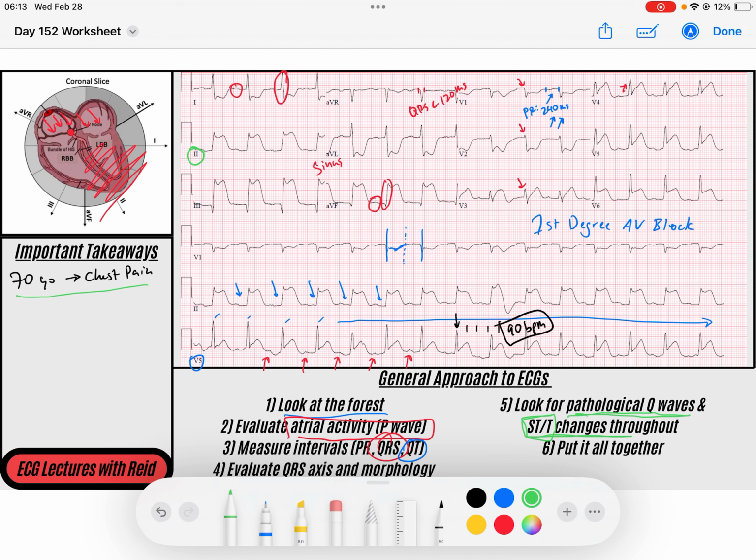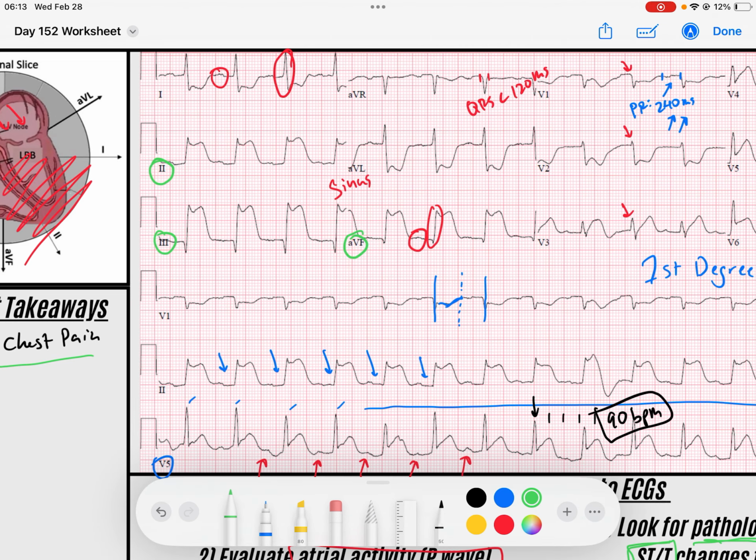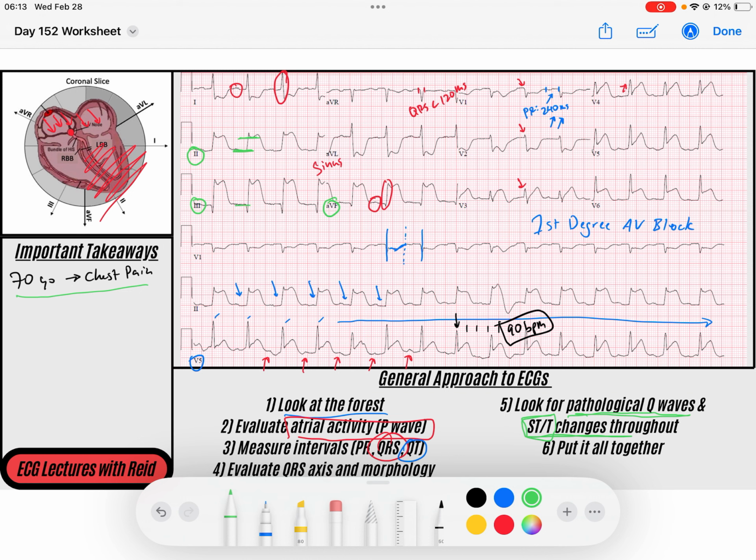So the first thing I think we all noticed is we looked at these inferior leads, and maybe we skipped a beat after seeing those, right? And you look closely, you don't even need to look closely, but here's our baseline. And look at this significant ST segment elevation in these inferior leads. Baseline, ST segment. Baseline, ST segment. So there is significant inferior ST elevation, right? Those are up arrows for elevation.